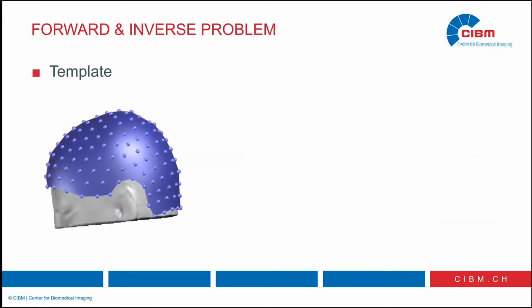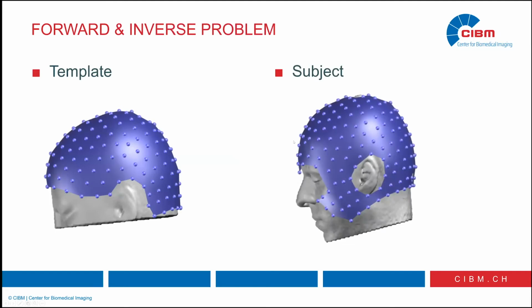And more specifically, the guideline for today is about the subject. So what are the real problems with real life MRIs, real life electrodes, what's happening, how we can solve that? Because very often the templates are already nicely pre-processed, of course, so there is basically no issue with the templates. The problems are with the subjects, or more specifically with patients from the hospital.